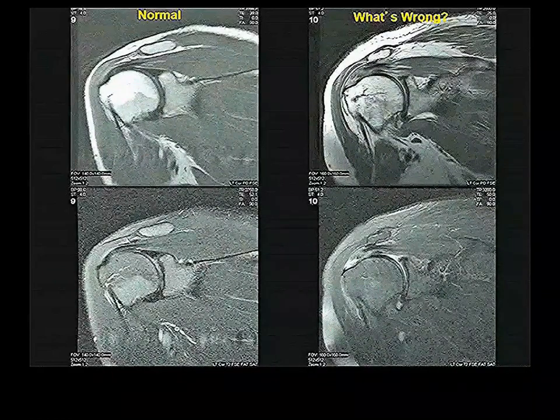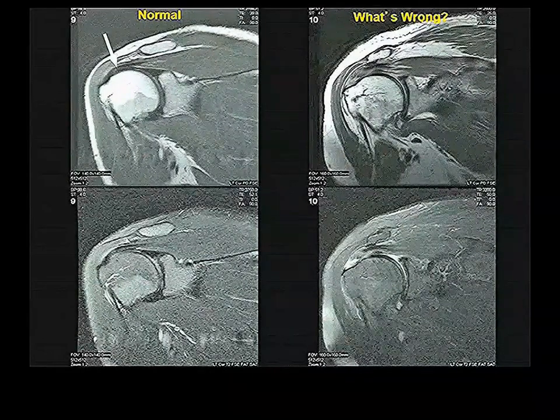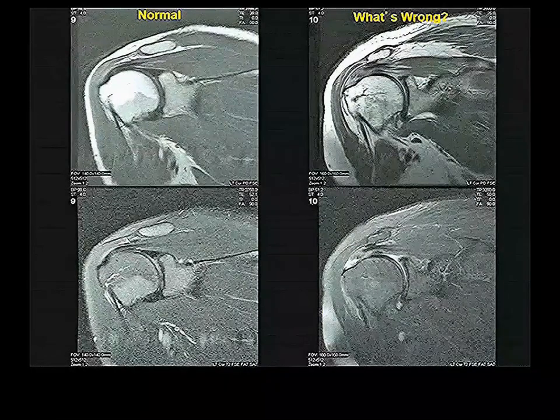You see anything odd about the supraspinatus on the right that you don't see on the left? It looks like it's not attaching to the... Yes, you are right. Very good. So you probably knew the answer all along. This is a nice supraspinatus. This little black thing is its tendon.